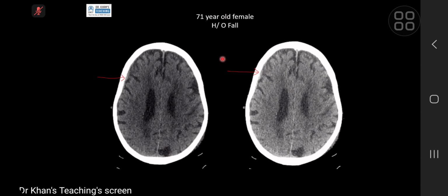Now, what happened was in this case, this is a countercoup type of injury, which is very rare to happen like this as a countercoup subdural. But in old age, because the CSF spaces are quite enlarged, the cortical veins are torn very easily. If you see here, the impact was here, and this is a countercoup. So the hypothesis is that these were cortical veins which just got torn apart.